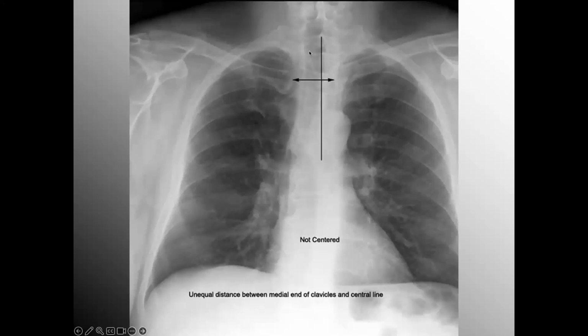It's radiolucent here. The reason it's labeled not centered is the center point for all chest X-rays should be the spinous process of the vertebral body. And that line is kind of covering it here, but here is a spinous process. And to the point I just made, this widest transverse process that I can easily delineate, that's going to be T1. I know that's where the thorax begins.